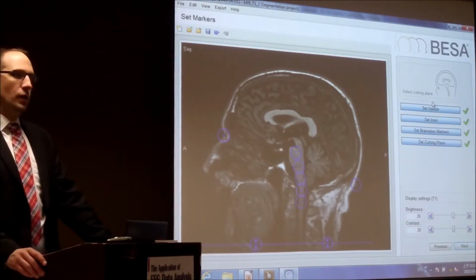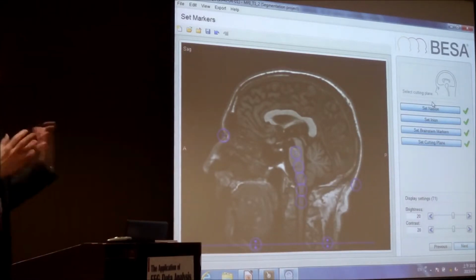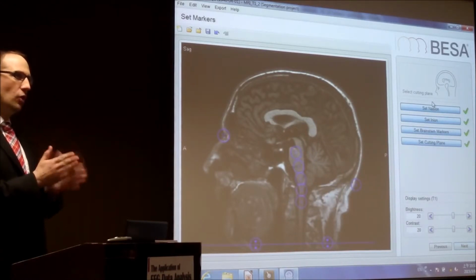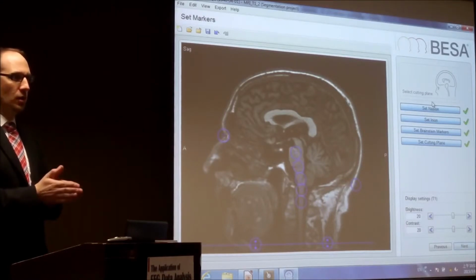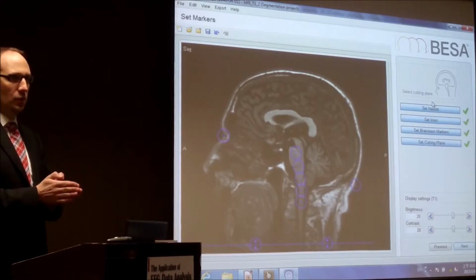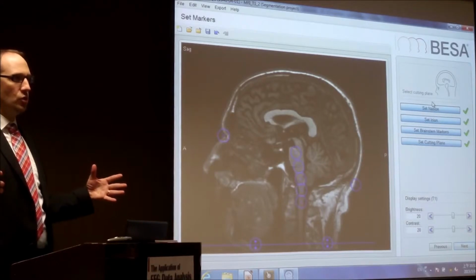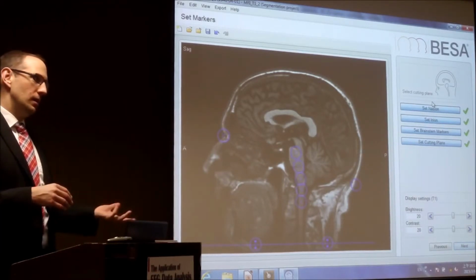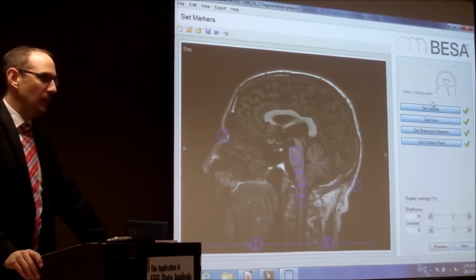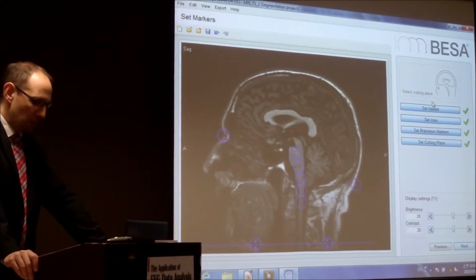The inhomogeneity correction, you have to imagine you're lying in the scanner, the whole experiment takes time. There I recorded some slices, and the contrast values of each picture will differ. Therefore, we do an inhomogeneity correction. We contrast all of the different contrast ratios, and then we try to get rid of that failure, this error you have there. And you gain a lot of precision in fact. And that's a very important thing about that.